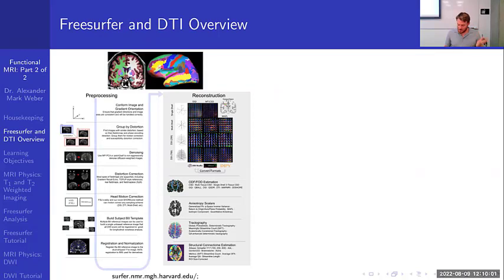So today I'm going to be talking about Freesurfer. This is represented in the picture at the top here. It's a program out of Harvard that does a lot of good anatomical segmentation and surface-based analysis. So at the top here, we have the example where we have some basic tissue segmentation on the left: white matter, gray matter, deep gray matter structures. And we have some surface-based segmentation on the right. So you have identification of like Brodmann areas, I believe.